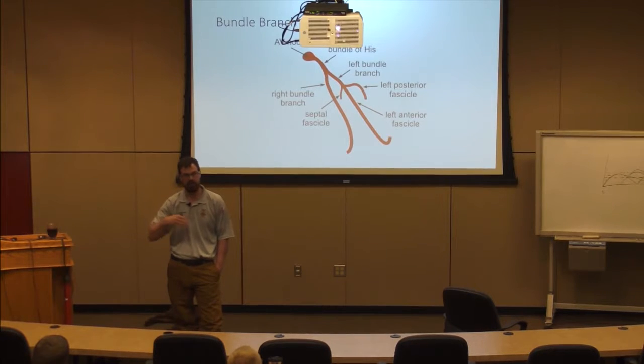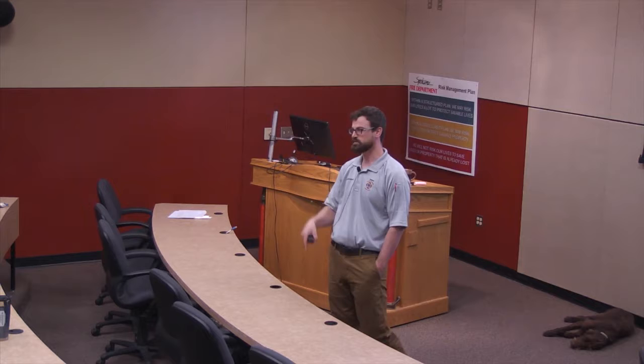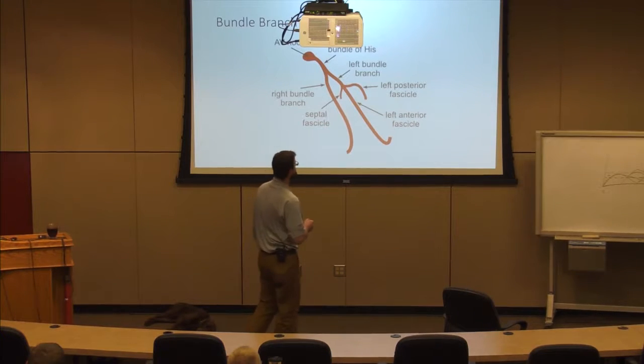So you have to be able to look at a 12 lead and say that's a bundle branch block. And you have to be able to look at a 12 lead and say that's wide, but that's not a bundle branch block, that's bizarre. Bizarre wide means electrolytes and toxicology. Normal bundle branch blocks, I don't worry about it. Make sense? So you really have to be able to look at an EKG and say, I'm 95% confident that's a bundle branch block. So we have to spend some time briefly reviewing bundle branch blocks.